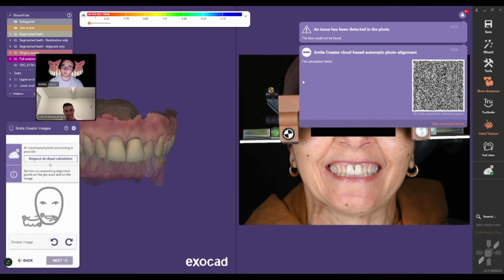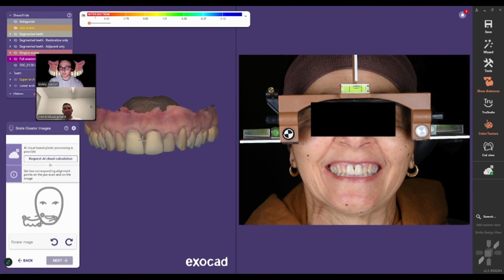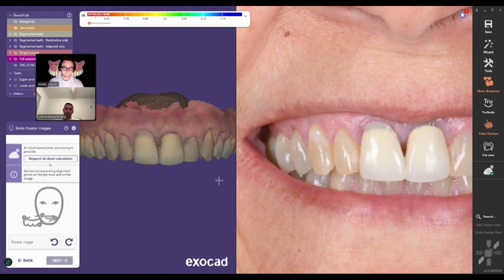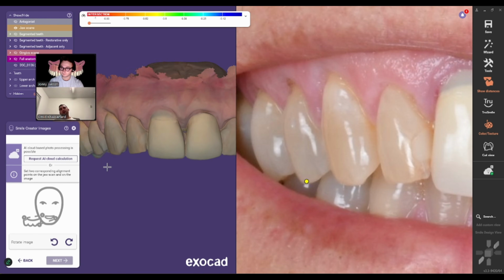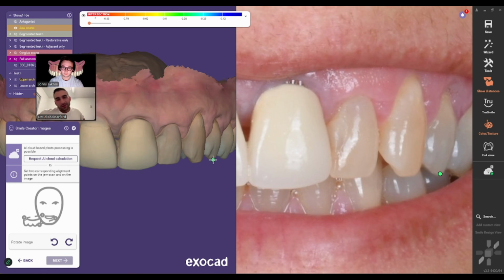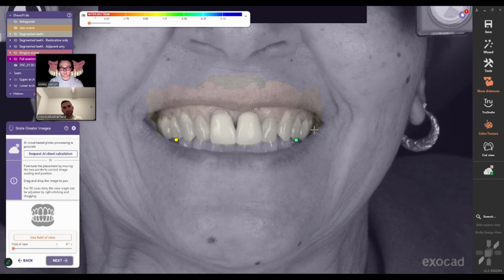Oh, and as I said, I jinxed it. Maybe it was the eyeballs that I got rid of on there. Yeah, for sure. Which is fine, because this is a really great photo. It happened originally without the eyeballs blocked. Yeah, it happened the first time we did it. It's definitely blocking out the eyes for HIPAA, obviously. We don't want the eyes in here for HIPAA reasons.